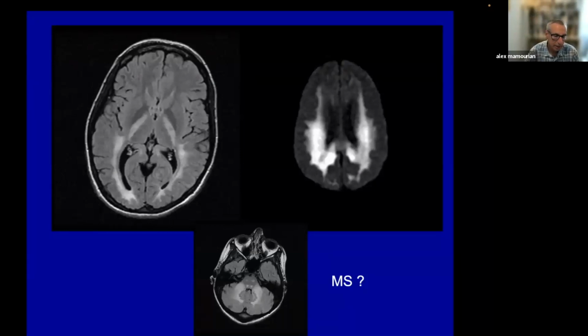So these age-related changes are probably a conglomerate of areas of ischemia, gliosis, areas of myelin pallor. They're probably not all the same thing. And so I generally put them in that basket rather than calling it microvascular disease or some hypoperfusion syndrome, which implies there is a clear vascular cause or underlying vascular abnormality.